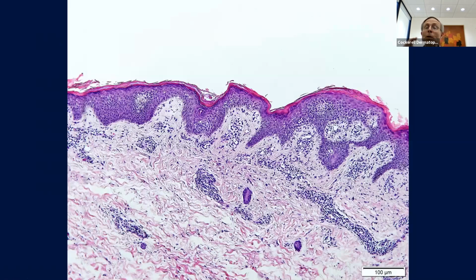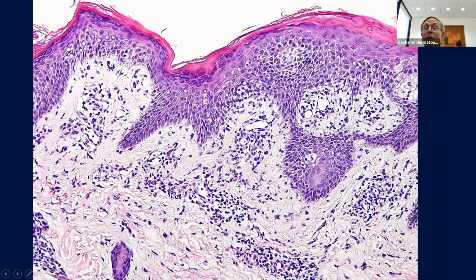So slight spongiotic dermatitis, superficial lymphocytic infiltrate, mounds of parakeratosis with no neutrophils, with some serum or plasma within the parakeratotic areas. And then maybe if we look carefully, we might see a couple of extravasated erythrocytes like over here.